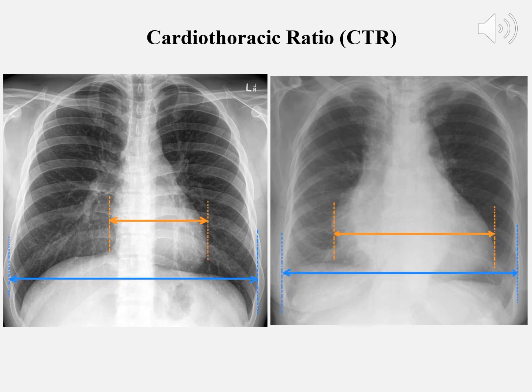And an old school method some of the guys used to do would be to measure the heart with your finger and thumb on the image, measure how wide it is, scoot that over into the left lung, and it should take up that width. The width of the heart that you measured should be the same width as one of the lungs, right? So if 0.5 is the number you're coming out with, that means your heart should be half as wide as your chest cavity. So think of it in those terms.